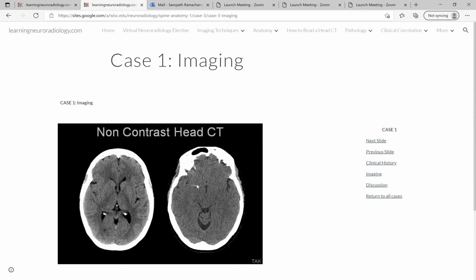Unfortunately, we don't see this a lot. In a lot of patients with strokes, it's very difficult to see this sign because it doesn't show up in every single CT. So it's not that useful. If it is there, it is great, but unfortunately, you cannot rely on that. So if you have a very high clinical index of suspicion that a patient has a stroke, you should not just depend on this alone to make a diagnosis. You have to use tools like MRI to do the problem solving for you.